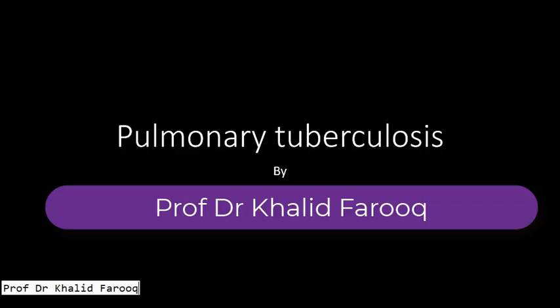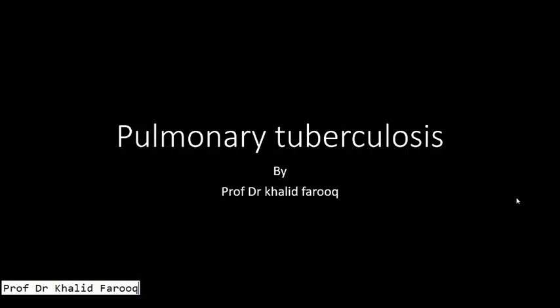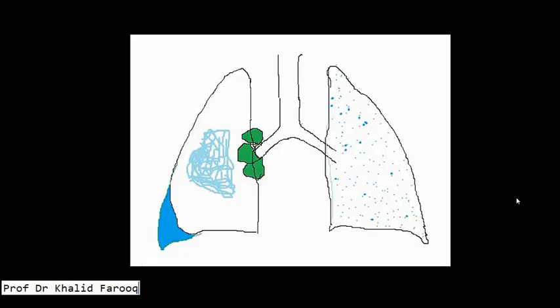Today we will discuss imaging characteristics of pulmonary tuberculosis. Here we have a schematic diagram where we can see right hilar lymphadenopathy, number 1, number 2 consolidation, number 3 pleural effusion, and number 4 miliary pattern of the disease.